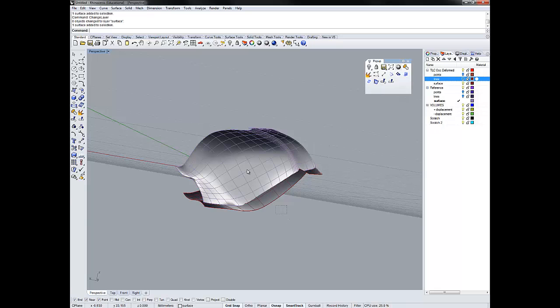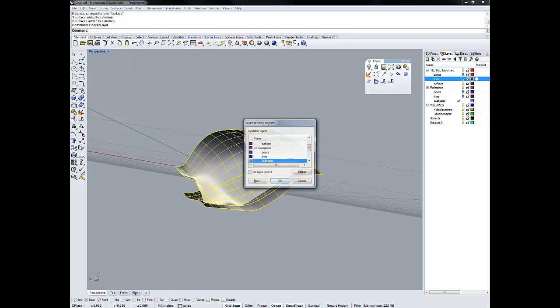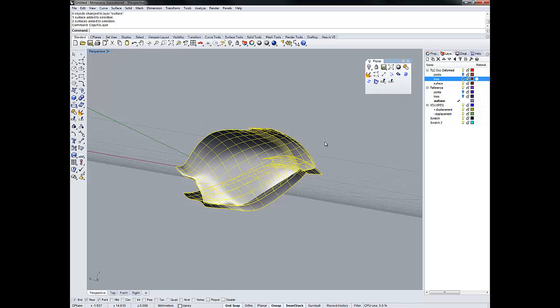We're going to take this data and copy it into a scratch layer, because there are a couple extra steps to this process, and we're going to be working with it for a while, and also chopping it up. So we want to leave these as is, but copy them to a new layer. We type copy, then to, and then layer. You can see that up there. Copy to layer. So hit enter, and we're going to copy them to this scratch layer here and click OK.